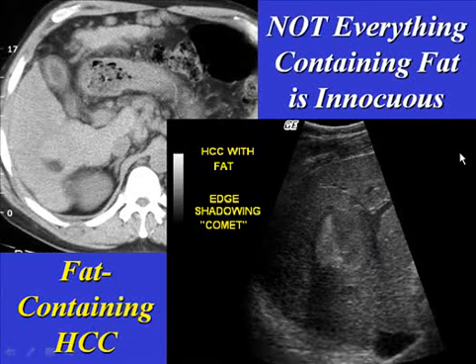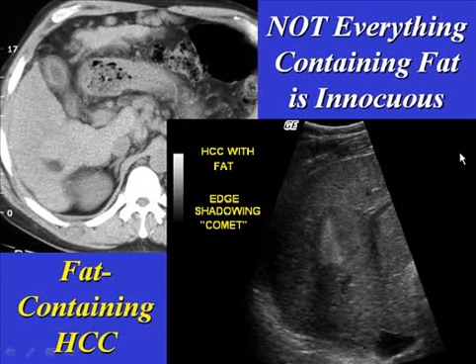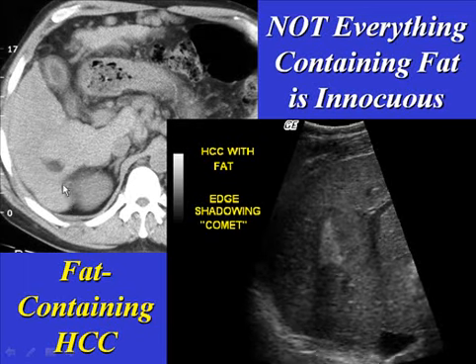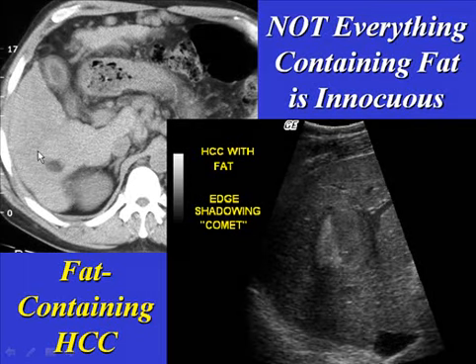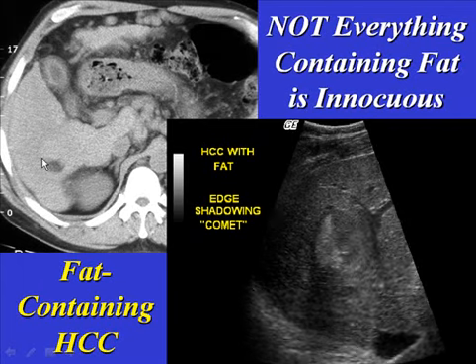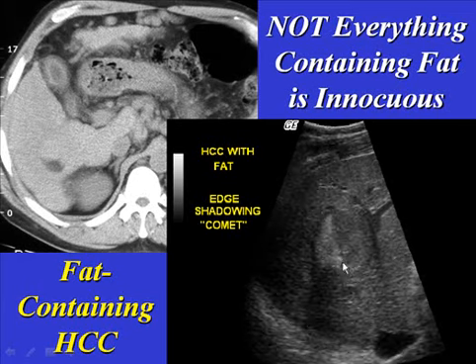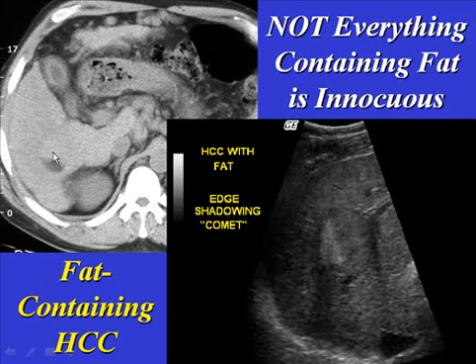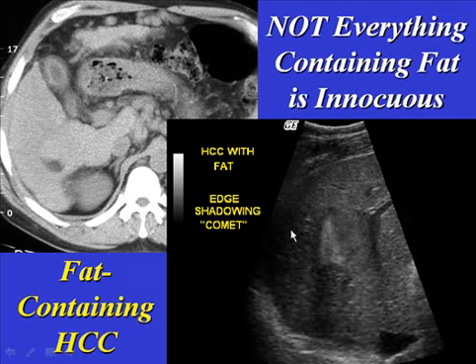Now, not everything that contains fat is innocuous, okay? Here's a patient who has hepatocellular carcinoma, and we can see on this non-contrast scan that there's a definite fatty component to this HCC. HCC is one liver lesion that has fat in it focally, not terribly infrequently. And here's the corresponding ultrasound with the less affected soft tissue area and the echogenic fatty area.